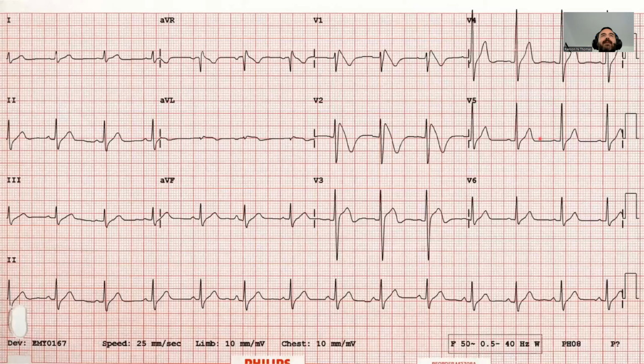And so that's what you're capturing, right? They're broken down into lead 1, lead 2, lead 3, AVL, AVF, V1, V2, V3, V4, V5, V6. So these are all the transmission of electrical signals from one lead to the next, right? Typically, when you're looking at a rhythm strip, you're going to see lead 2, that's usually what we see. And the way to read and interpret this can be a little confusing.